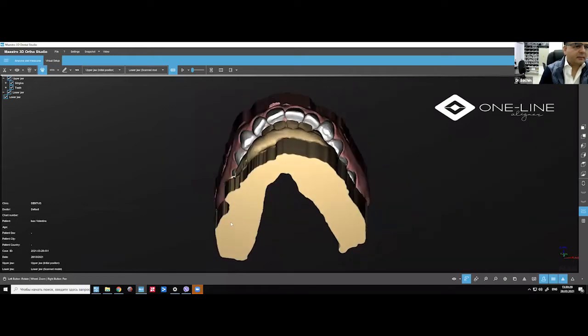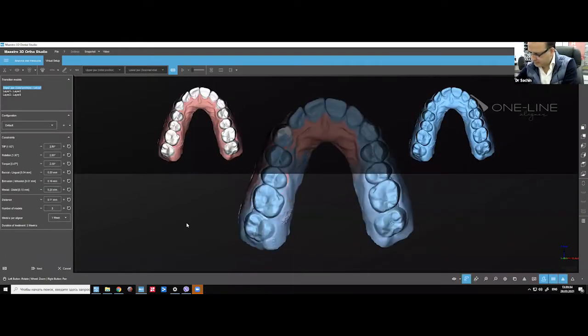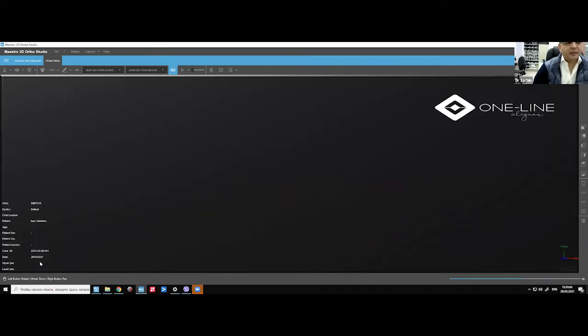Okay, so yes, okay, so it's going to be 2. Again, 2. Yeah, so it's going to be 8 aligners. I was thinking around 6, but it's going to be 8 aligners because we have done the movements in parts.